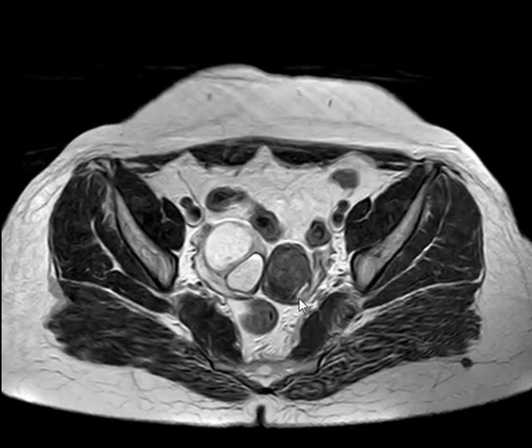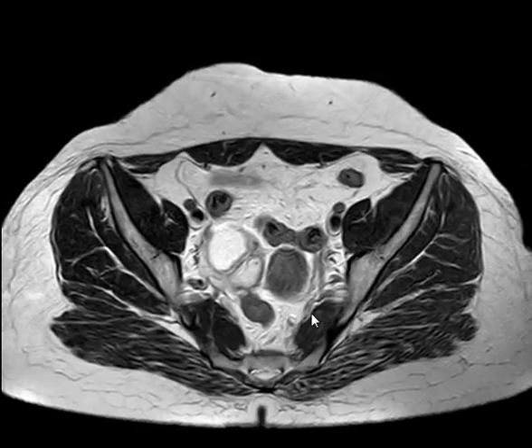Here it's the same findings. This hypointense mass signal in the left adnexa and a multiloculated cystic appearing lesion. So all the sequences we have seen so far are T2. So we need further information by seeing T1.